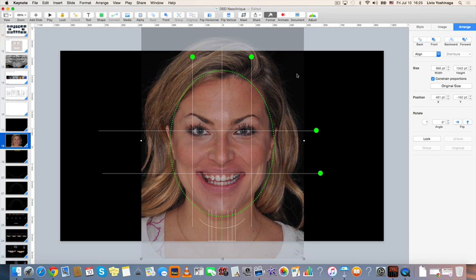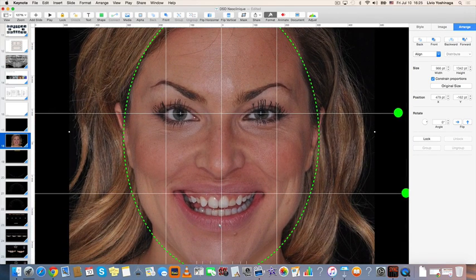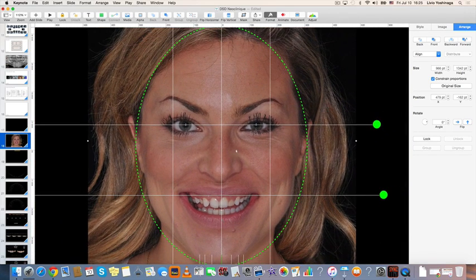Click on her face. I go with the arrows on my keyboard, right and left, until I have found the best midline. So I look at the glabella, I look at the philtrum, and I use them as a nice reference to find the best place for her face, probably giving a little bit more attention to the philtrum if she has a very nice lip design.